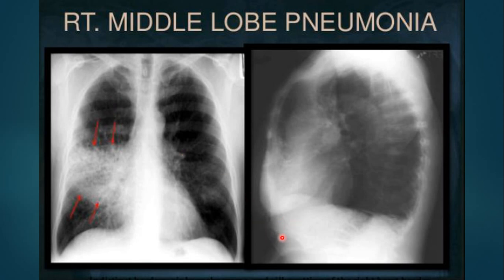Okay? And on the lateral chest x-ray, you can see this is the middle lung lobe, opacified here to confirm that this is consolidation. There is also evidence of COPD, chronic obstructive pulmonary disease, due to the hyperexpansion of the lung, and you can see the reticular pattern here indicating airspace opacification on a background of interstitial lung disease.